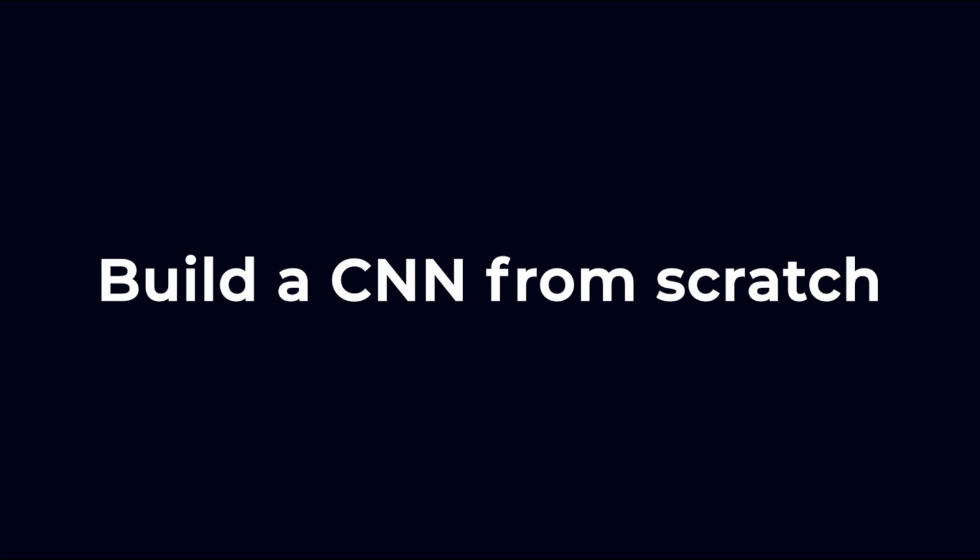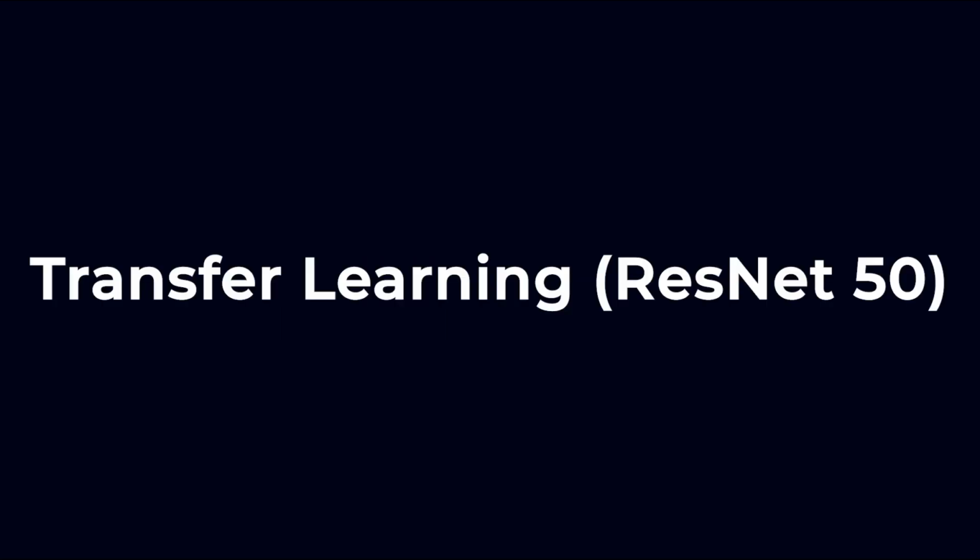In this single video, you will learn how to build a CNN from scratch, leveraging the advantages of using transfer learning from ResNet 50, understand the inner workings of residual networks, and master image segmentation to identify objects at the pixel level. Without much ado, let's get right into coding.